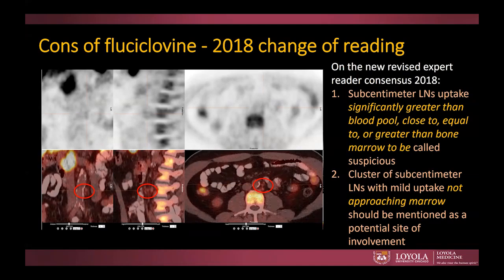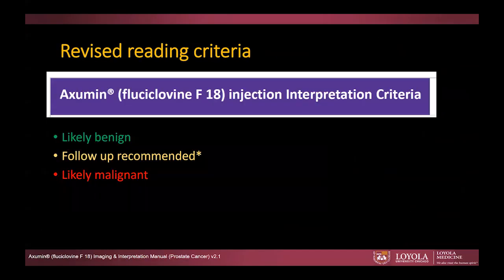And here it's probably suspicious just because we know there is another lymph node that was biopsy positive, but you probably don't want to call all of those lymph nodes that you see, because then you decrease specificity significantly.